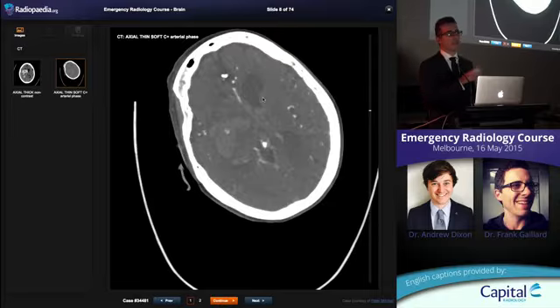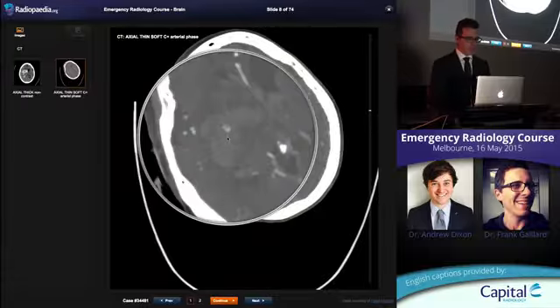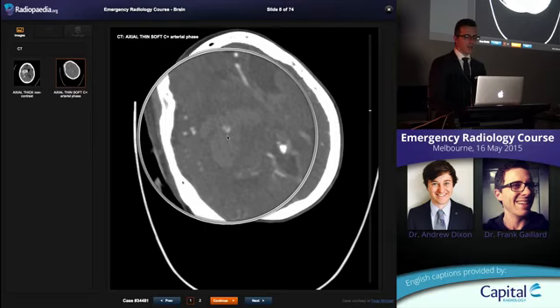If you're at a hospital though that is trialling or using procoagulant therapy in these patients, you may be doing a CT angiogram to look for this, which is the spot sign. And this shows just acute extravasation of contrast into the clot.